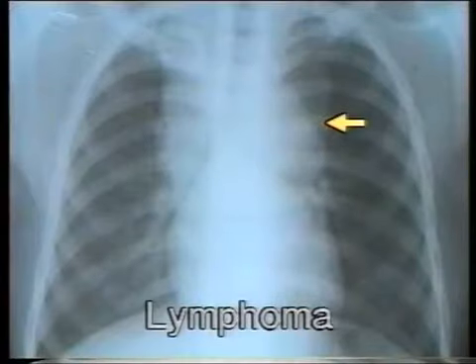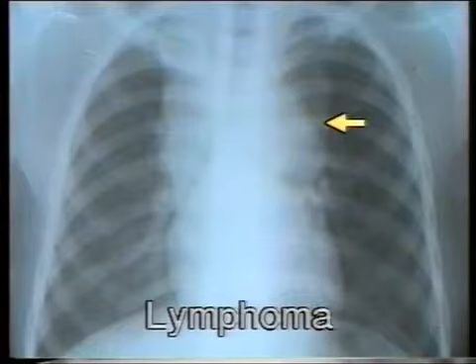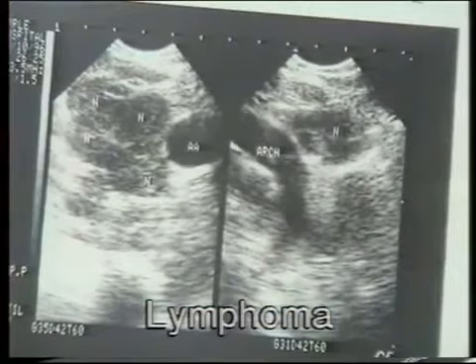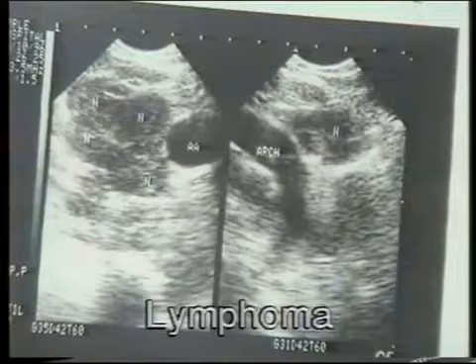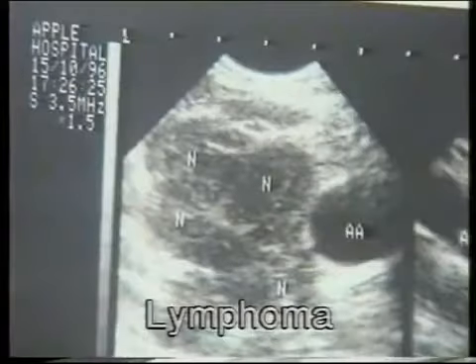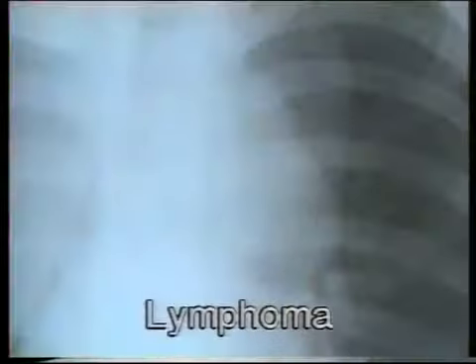This mediastinal mass showing bilateral widening has a characteristic lobulated border, especially on the left side. This is a lymph node mass. Such large and bilateral lymph node masses are almost diagnostic of a lymphoma. Lymph nodes of tuberculosis or metastasis never grow to such a large size. I also have an ultrasound picture of this patient taken from the suprasternal notch showing the large and multiple lymph nodes surrounding the arc of aorta, thus confirming that this is a lymph node mass. Note again its typical lobulated border.